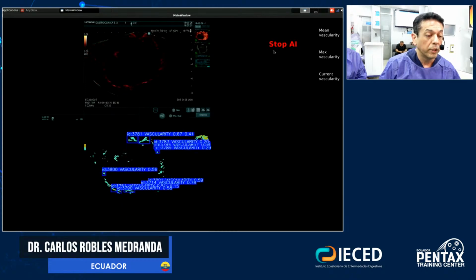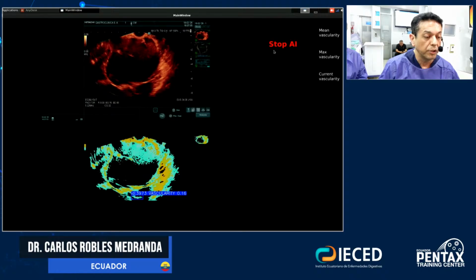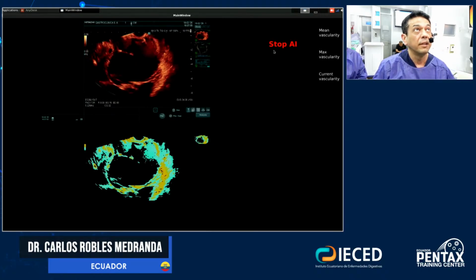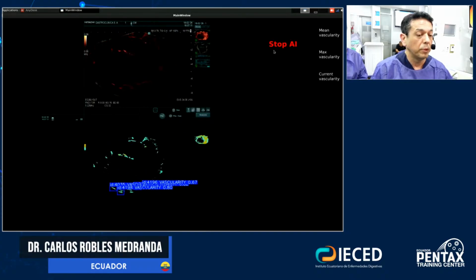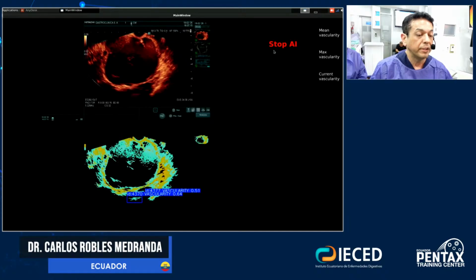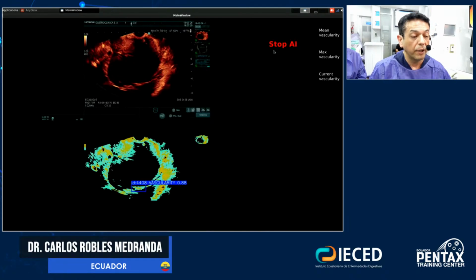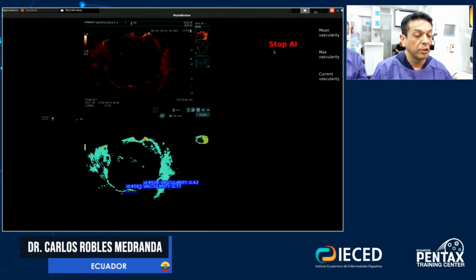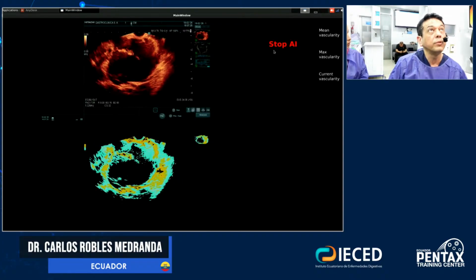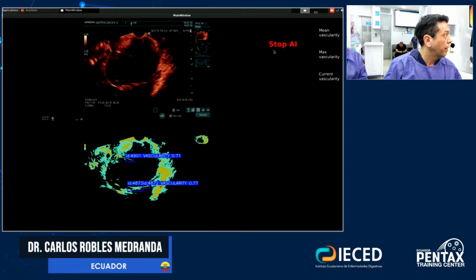Right now, I am looking, in a small series of patients that we started to do in our institution. We are looking at this, and we are seeing that this will help. This will be the future of new evaluation of these lesions, having a very good objective way to measure the microvascularization and not just to say there is or there is not, right? So we know that the walls, you see, have a lot of microvascularization. So the software is showing everything.